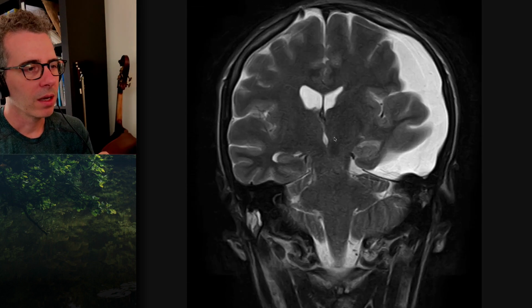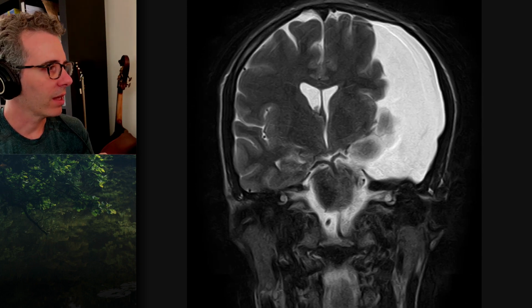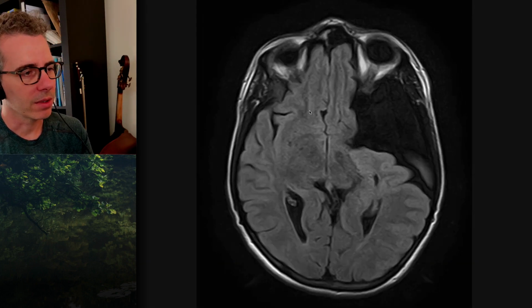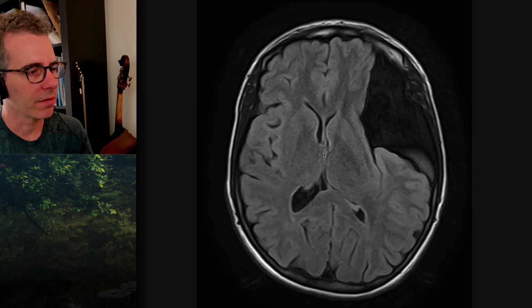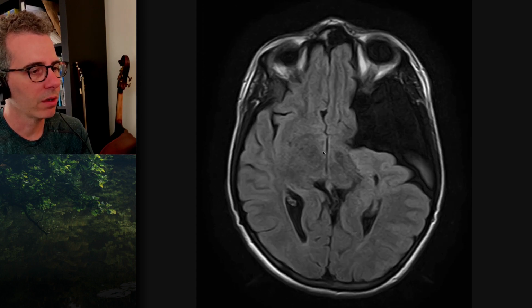That's what you'll see. And just notice that on FLAIR, on every routine scan, and this person doesn't have it, but many will have a similar area of failure of flow suppression in the frontal horn due to a jet of CSF through the foramina of Monro.